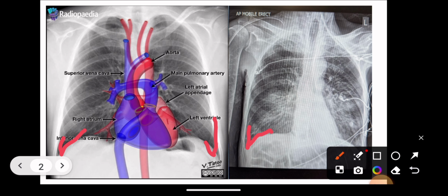Another thing we associate with fluid in the pleural space would be a visible and obvious horizontal fissure, which again we're not seeing here. So just looking at this guy's x-ray, he's well ventilated. He's probably a little bit too much, so we need to do some expiratory techniques with him. He has no endotracheal tube, but he was sputumy and therefore needs some secretion clearance techniques.